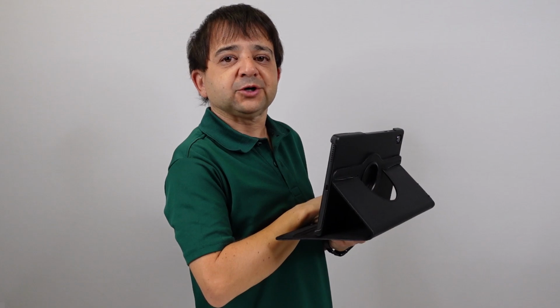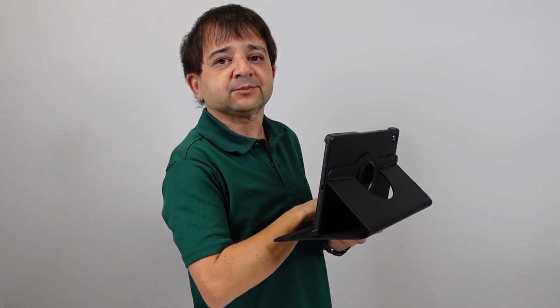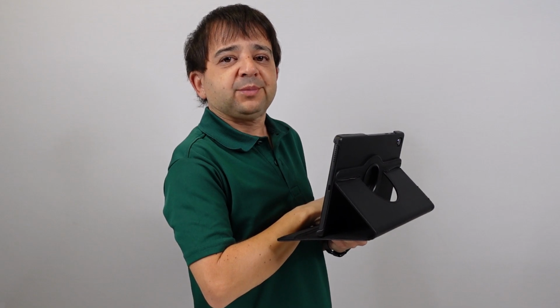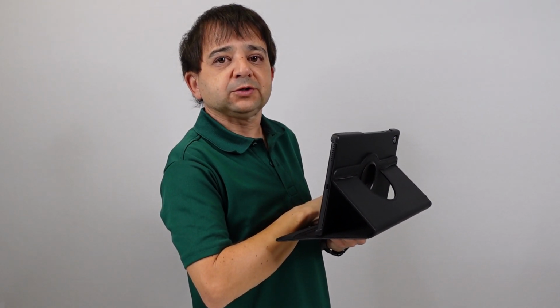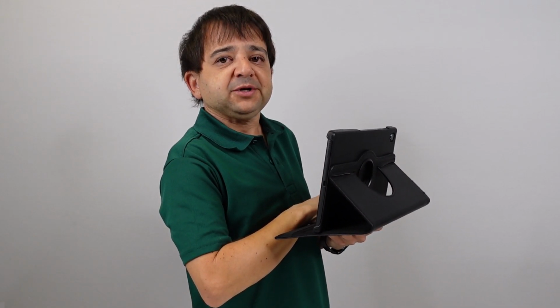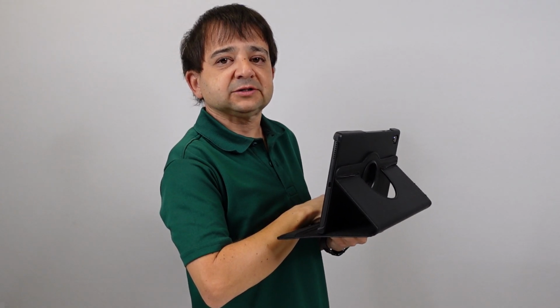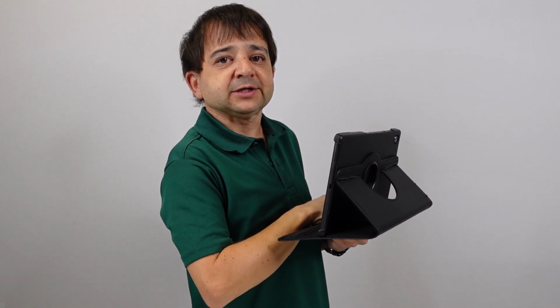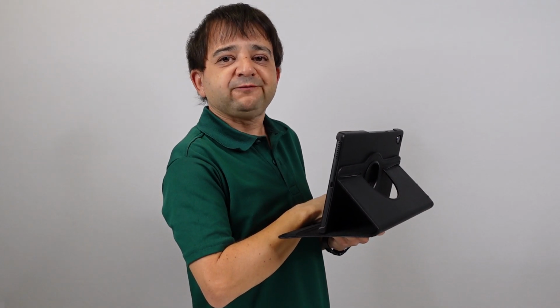In our last video, I introduced you to augmentative and alternative communication, and I talked about augmentative and alternative communication boards, also known as AAC boards. Today I'm going to talk about high-tech AAC boards, and I'm going to introduce you to WeaveChat. WeaveChat is an app that's available for free on Apple iOS devices, Android devices, and even on computers. Let's check out how WeaveChat works.